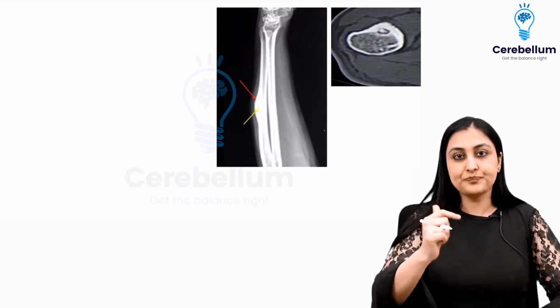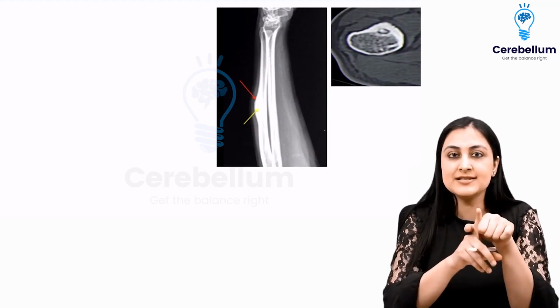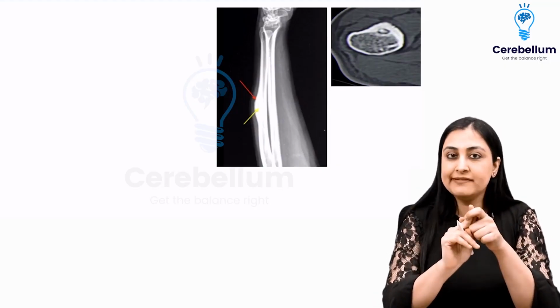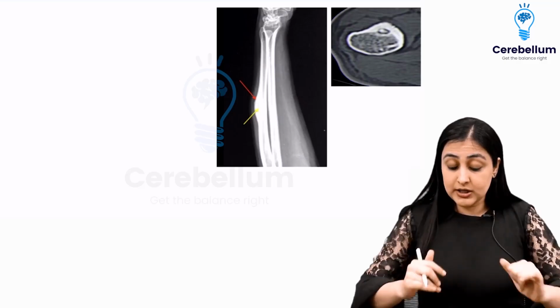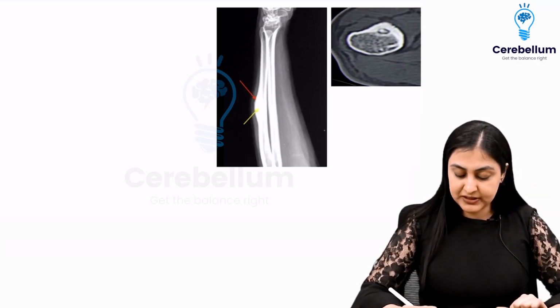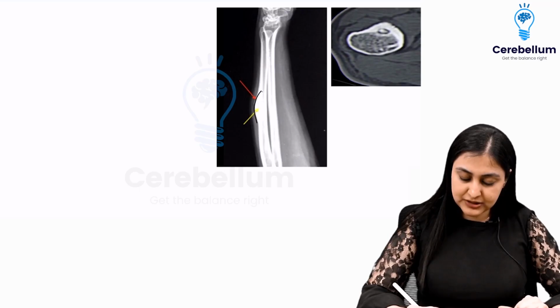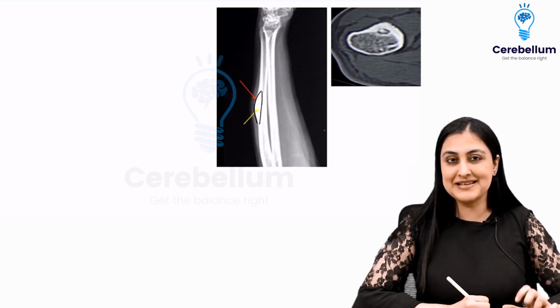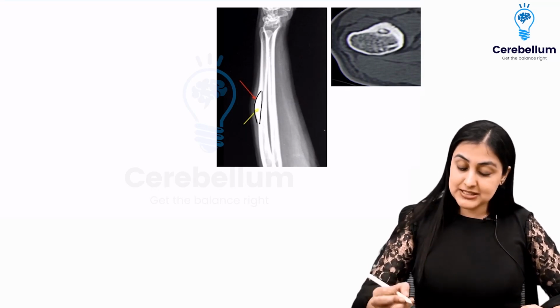epiphyseal tumors. Now we discuss the three diaphyseal tumors. What are the DDs? Osteoid osteoma, Ewing sarcoma, adamantinoma. Three vowels sticking together. The first tumor that we are seeing here, we can see it's a small tumor in the diaphysis. All I see is some sort of solid periosteal thickening, and there is a cortical based very small tumor. It is better visualized on CT here.